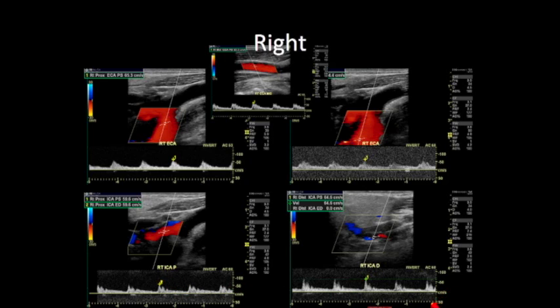Any problems here with anybody? Anybody have any problem? Pardon? The internals look like the external. Yeah, the big vessel kind of looks like an external carotid, and the little vessel looks like, I'm sorry, is labeled external. And they're switched. I thought. So I called her up, and she goes, pfft. And then I said, would you? So then I had to beg, you know, it's because you only think that you're in charge of anything.